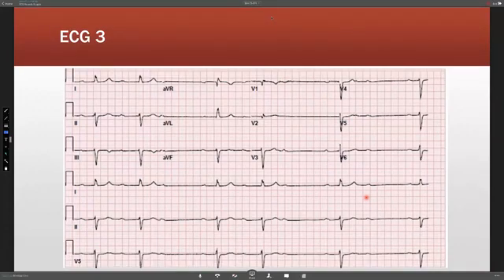So Fathi, what's the difference between high grade and intermittent complete heart block? Or are they the same? I think they're relative. When you get complete AV block, it means there's no communication between the atrium and ventricle, and that by itself is a high grade block. Complete heart block is a high grade block.